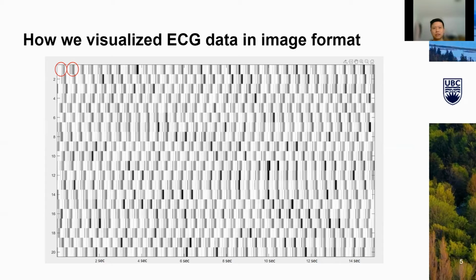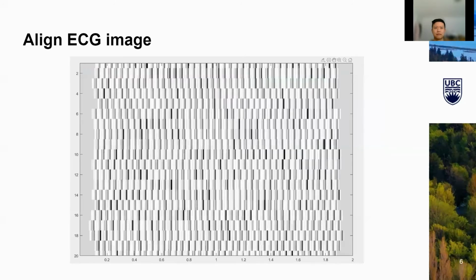We have about 30 peaks per row, so that's 700 cycles in 5 minutes of data. About 25 minutes of recorded ECG data is visualizable on one page. Compared with the traditional one-dimensional display that will take 180 screens, we're able to see the heart rate behavior on a large time scale. We can't do that in the normal display.